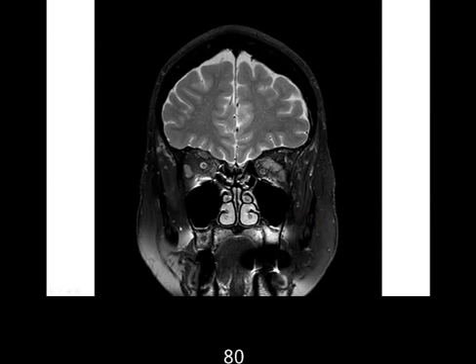This patient has a big eye, and the doctor was concerned that there was a carotid cavernous fistula, and then it turned out this patient does not have it, just because of a big meningioma. This part of the bone is too big, and this part of the soft tissue is too big, because there's a meningioma here. And this is the normal side, the thin bone, not much soft tissue compressing on the optic nerve and the whole eyeball. This is a normal optic nerve, and this is an optic nerve that was displaced away from this mass. The patient has a big eye, and I guess maybe it's a little bit pulsatile, but this is a mimic of a carotid cavernous fistula.